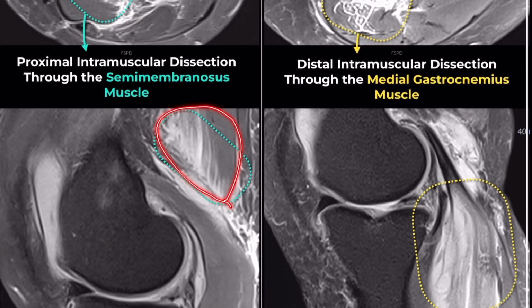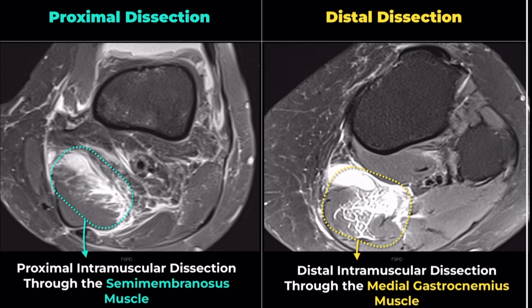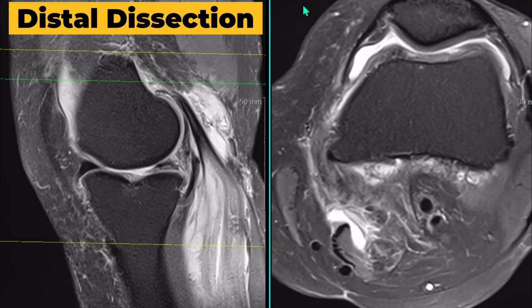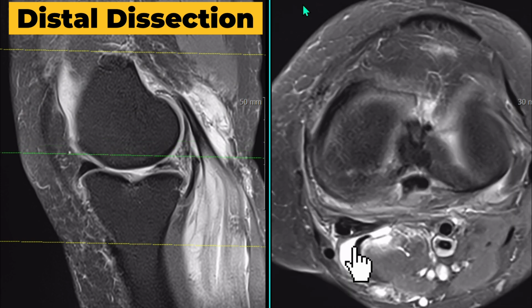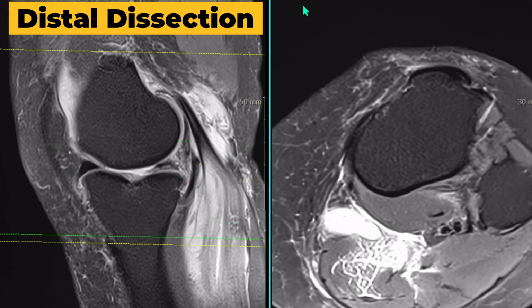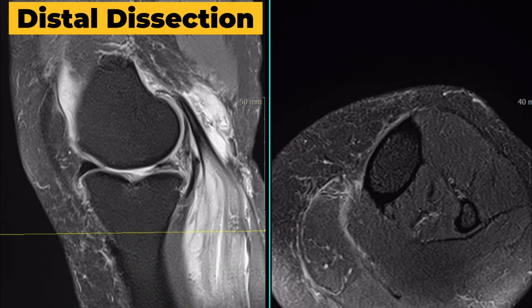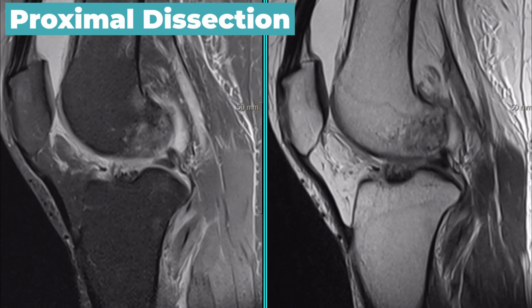It's worth noting that both of these cases can mimic trauma-induced myofascial muscle tears on imaging. However, there's a key distinguishing feature we must look for: the Baker's cyst neck. This structure extends to the posterior aspect of the knee joint, located between the semimembranosus tendon and the medial head of the gastrocnemius. Identifying this characteristic helps us differentiate these dissecting cysts from other pathologies.